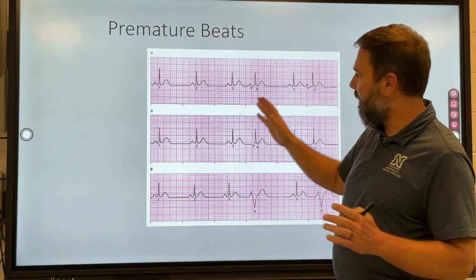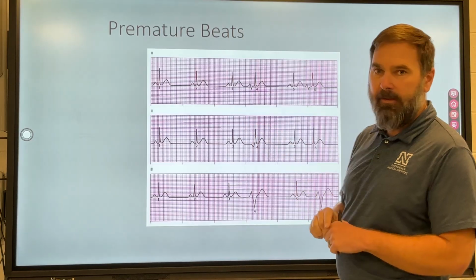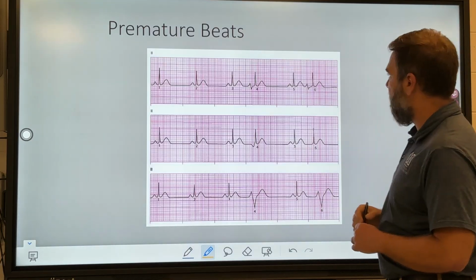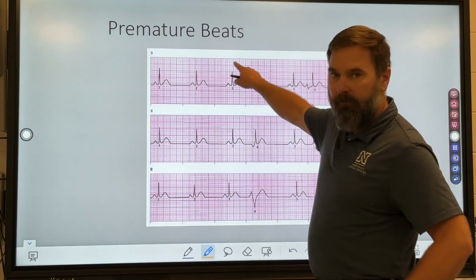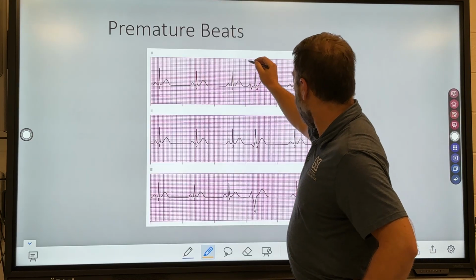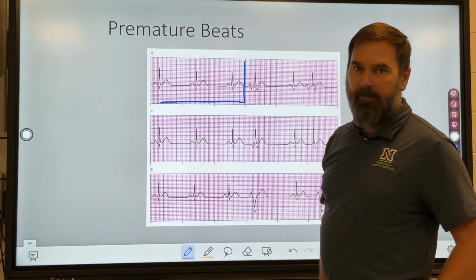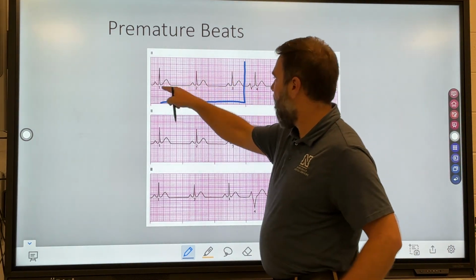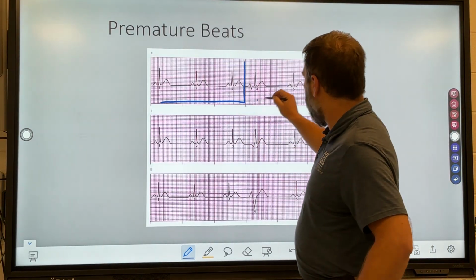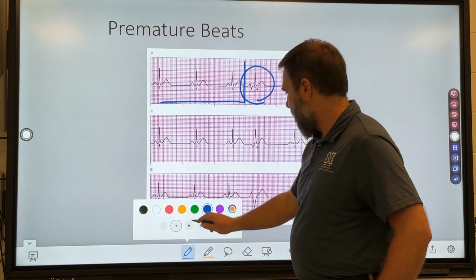We recognize it's irregular, and then we need to figure out where it is irregular. So if we can take a moment to figure out, well, there's some irregularity here, and this part is regular. So what are these complexes? What's normal, what's abnormal? We can say that this is abnormal, and we're going to look at a couple of different viewpoints here.